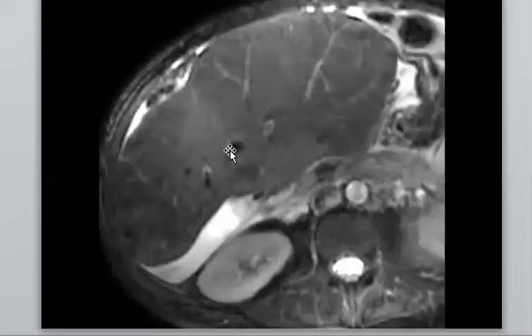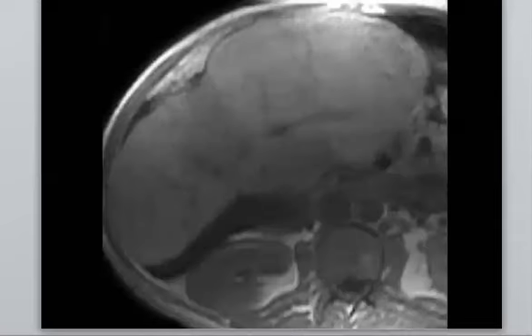And he did MRI, so this should be the T2 fat suppression. And again, you have the collection, so steatosis, perfect. So this is a case of steatosis, and here you can see clearly in T1 that there is no mass appearance.